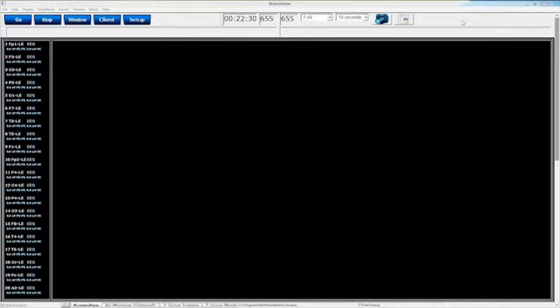Now, just so you guys know, this information that I gave you might be specific to the BrainAvatar, some of the new features and functions, but the Event Wizard, as far as the functionality, hasn't really changed between the 3.0 or Discovery software. So a lot of the things I showed you are going to function perfectly fine in those softwares, as well as the BrainAvatar software.